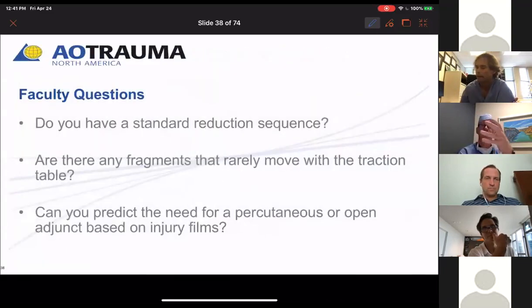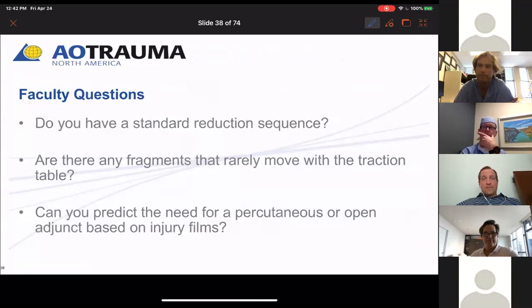All right, so that's not changing the bone, that's changing the beam. Yeah. Okay. So what do you do in cases where it appears that the greater trochanter is posteriorly displaced and it's not moving with rotation? I don't do much, honestly, specifically. If it's that comminuted, then I kind of bridge past it, nail through it, kind of thing.